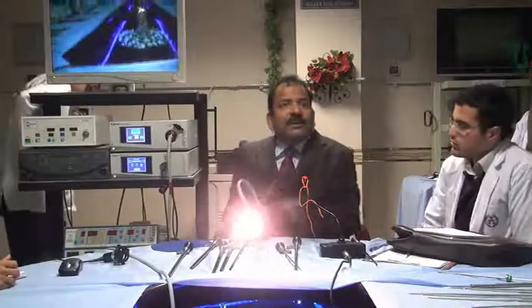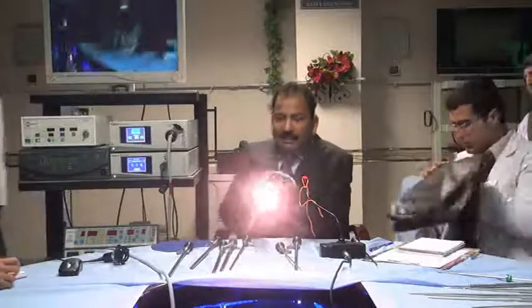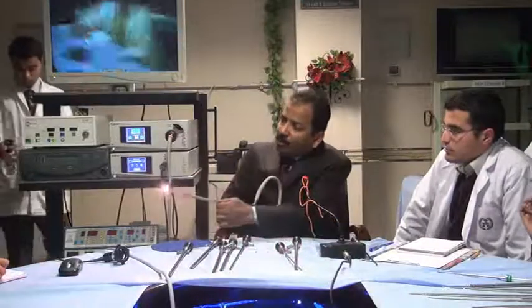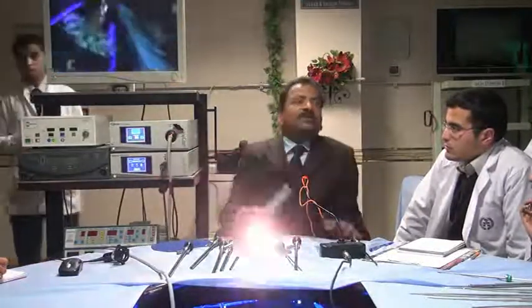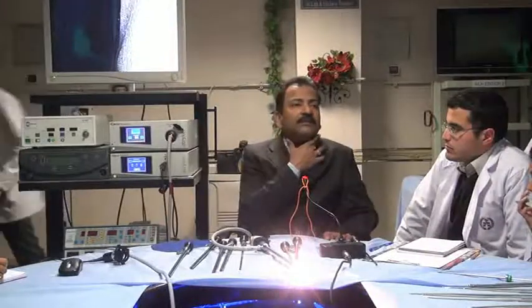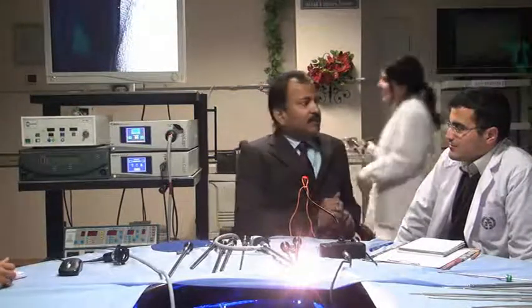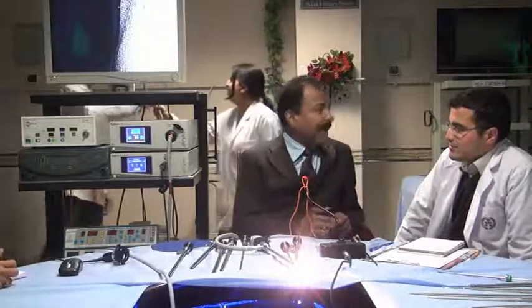If you have to see this light, I will keep it down. But this change will not happen in 0 degree. In 0 degree, changing this doesn't make any change. If I have to see her, I need to rotate everything like that. We say the 0 degree telescope is just like people with cervical spondylitis. If you have to see, you need to move the entire body like this. You don't have a flexible neck.